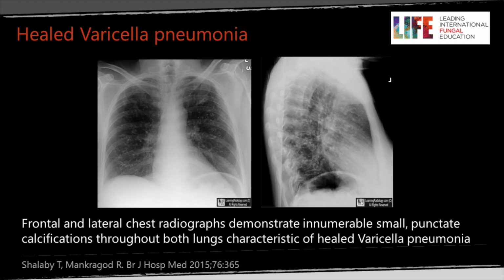This patient has had varicella pneumonia. If the person was acutely unwell, these nodules would be much less white, much less dense, but now this is a long time afterwards and the nodules have calcified.